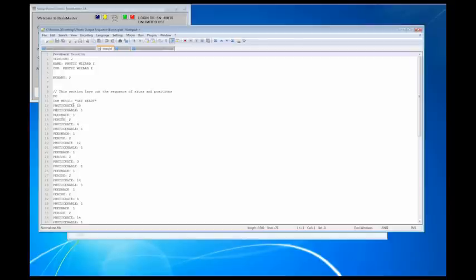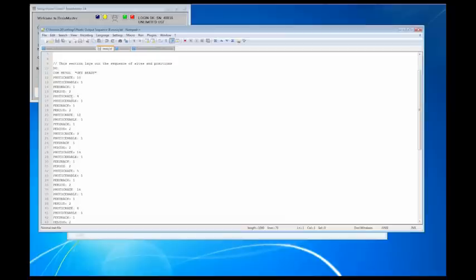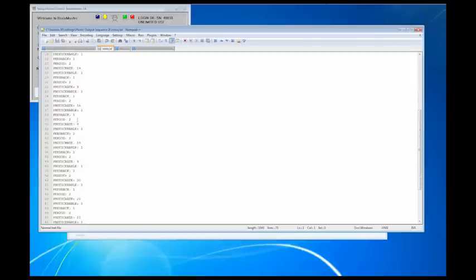So here we're starting at a rate of 10 hertz. We're saying that we're enabling it, and we're going to do it for 2 seconds. Then we're going to go to a photic rate of 4 hertz. We're saying it's on. We're doing it for 2 seconds. Then 12, so on and so forth. As you can see, we're jumping between the rates here. Now, this is one way of doing it.